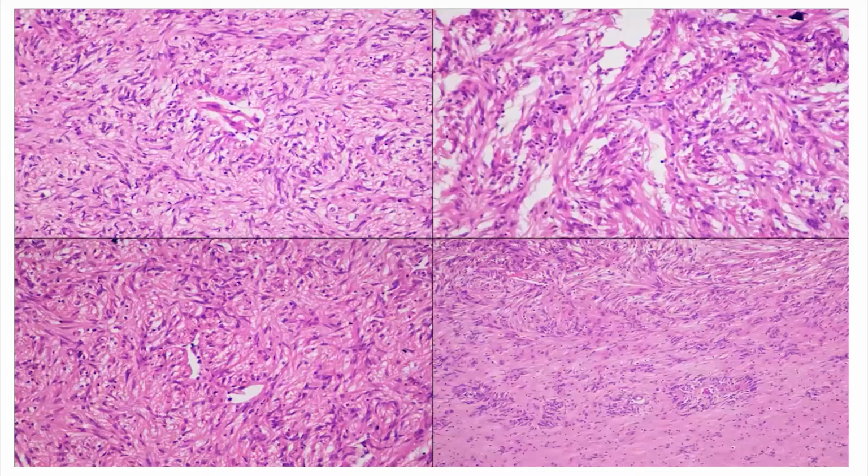And also, I would like to add one more point here. It's very important that in supratentorial ependymoma, which is ZFTA fusion positive, rosettes are very unlikely to be seen. It's very uncommon to see true rosettes or ependymal rosettes in supratentorial ependymoma, which is L1CAM positive, or ependymoma based on morphology as well. Although it's a remote differential, because I was not aware of this entity, the perivascular arrangement was making me raise a differential diagnosis of ependymoma. But I knew in my mind that it's not an ependymoma.